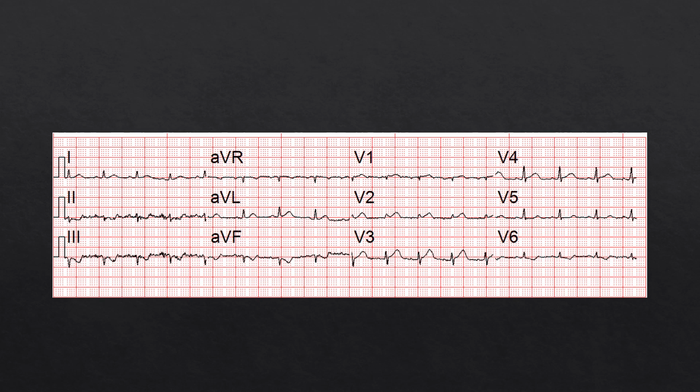And so if we scour this real quick, we can see this is the patient that has the hyperacute T waves in V2 with the check mark sign, maybe a little bit something in V1. Again, could be nothing, could be something. Definitely caught their eye because they were concerned based on the patient presentation. You'll also notice that because we're worried about anteroseptal, we look down at the inferior and we see these flipped T waves down here in 2, 3, and AVF, so certainly concerning.